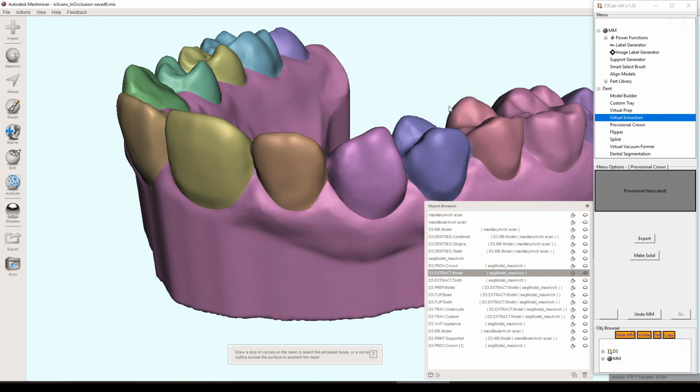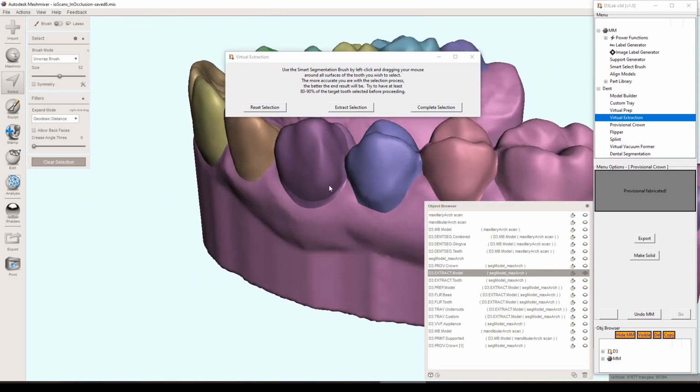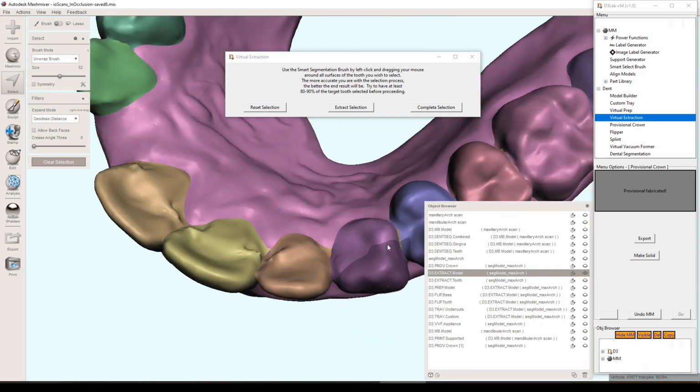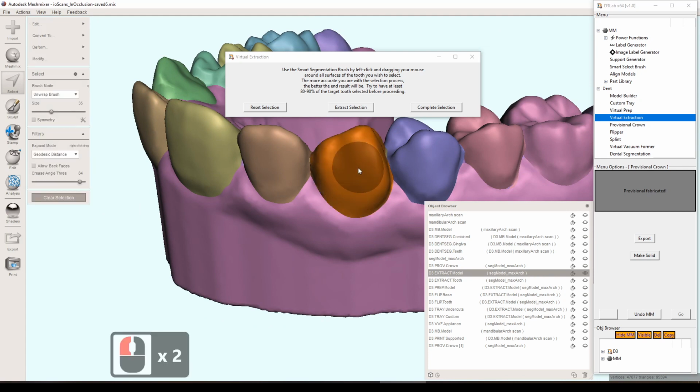It will expand it out and then bring it back in and basically select all, it'll fill in all those little places you didn't have selected before. So anyway, that did that and looks about the same, but either way, that's how you do it. If you don't want to use that, you still can just use the same brush and just double click on that.